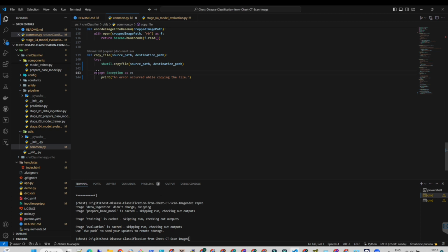So copy and then paste it. One more time I'll paste it because I thought currently there could be multiple options. So basically file not found exception, here it is.